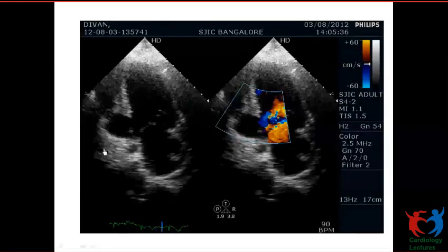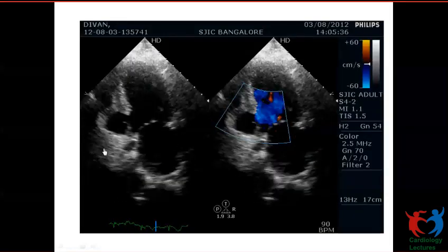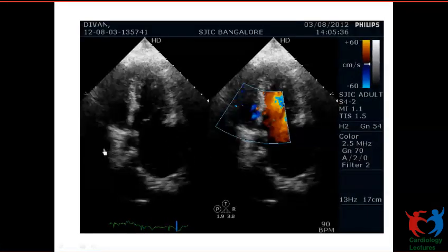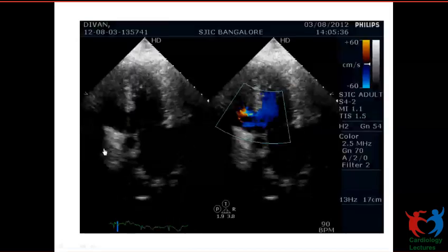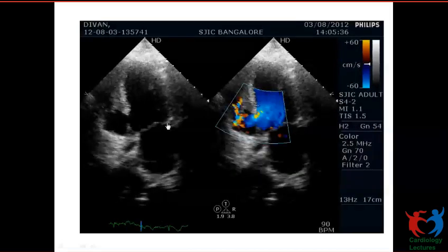That pseudoaneurysm, actually, is the containment at the site of the orifice, or is it containment from spreading further into the pericardial cavity, ma'am, because we are able to see the flow, no? Spreading, no, ma'am. Because they say that the rent is contained by the thrombus or the adherent pericardial tissue, ma'am, but we are able to see the flow to and fro so freely.